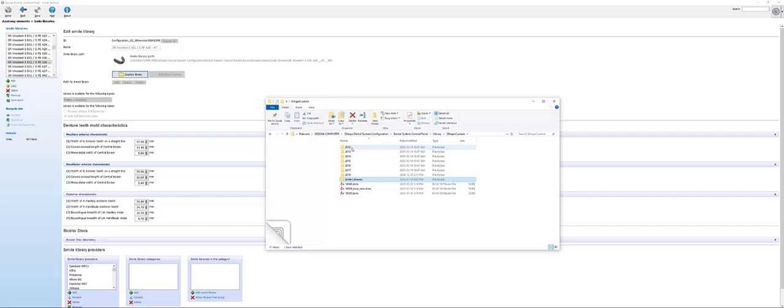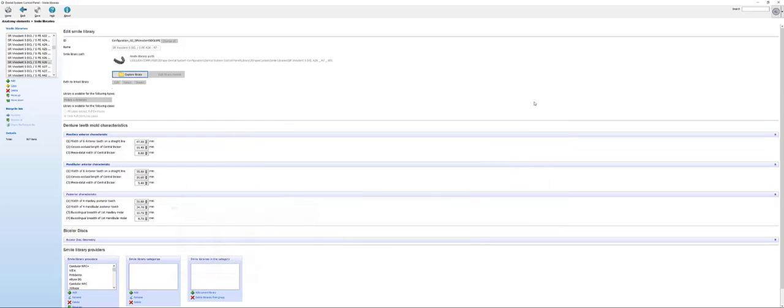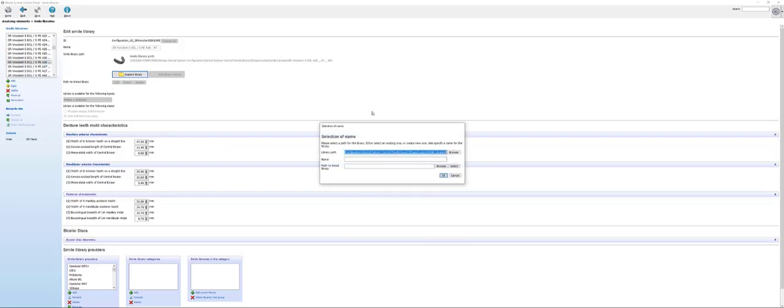Today, I'll be saving it in the 2012 folder. And in my 2012 folder, I have two more folders labeled Crowns and Smile Libraries. I'll be saving in the Smile Libraries folder. I'm going to go ahead and create a new folder for this Smile library. I'm going to name it SPE A26, A7, and 5. I can now minimize out of this, and copy the SR Vivident SDCL SPE A26 A7 and 5 Smile library.